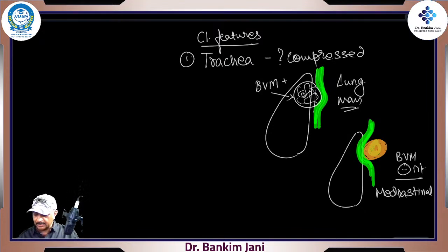It is a mediastinal mass. And when we say anterior, in the anterior there are thymus and lymph nodes. That means it could be either thymoma, the malignancy of the thymus, or lymphoma, when the lymph nodes are enlarged. And for lymph node enlargement, what is the best thing? We'll do the FDG PET scan, right?